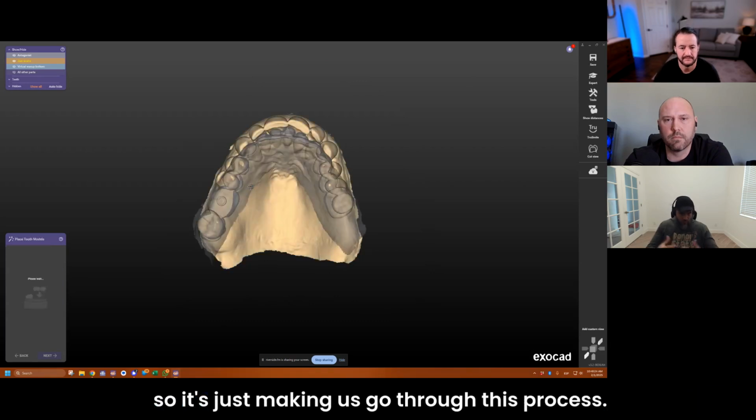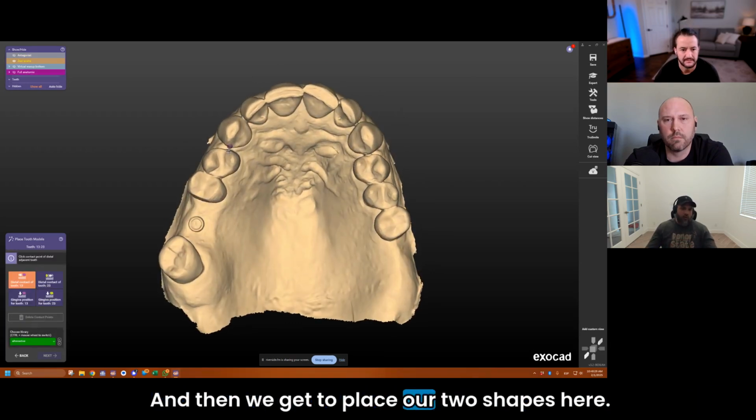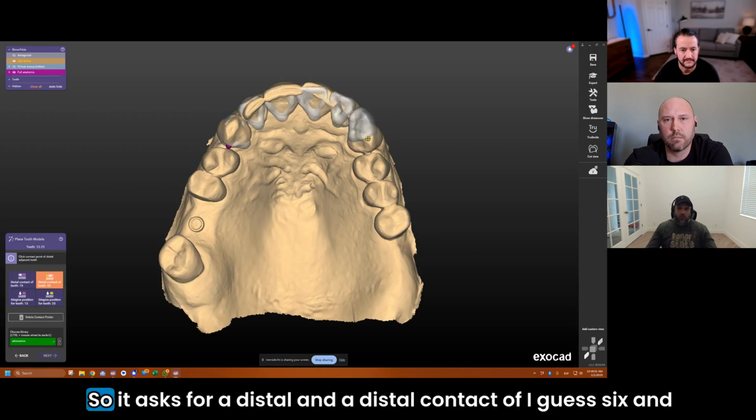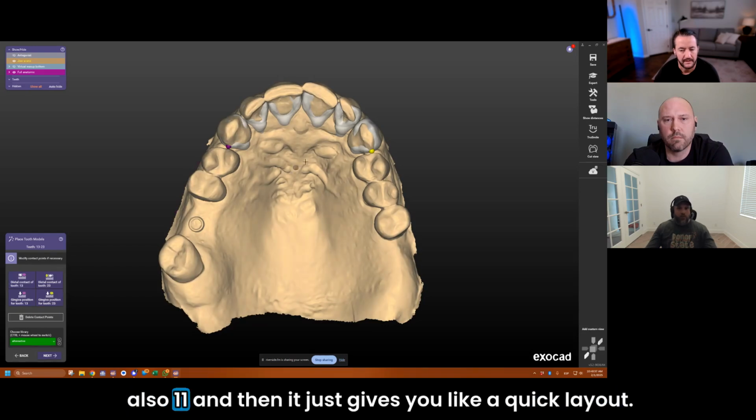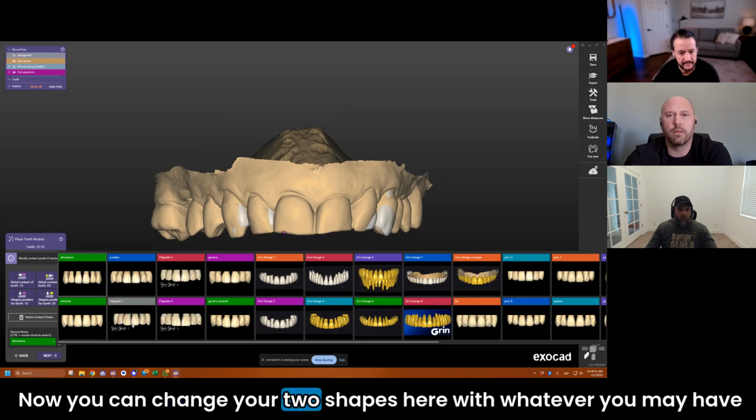So it's just making us go through this process. And then we get to place our tooth shapes here. It asks for a distal contact of 6 and also 11. And then it just gives you a quick layout. Now you can change your tooth shapes here with whatever you may have installed.